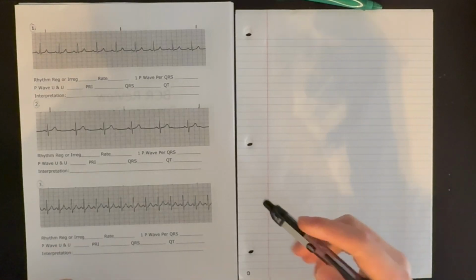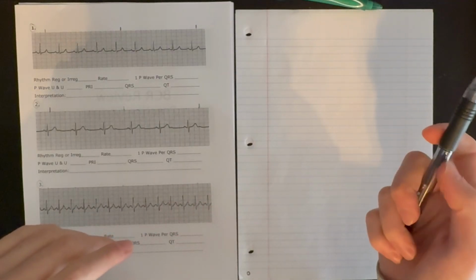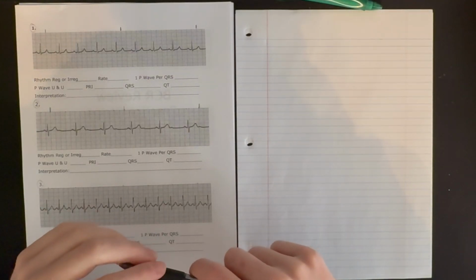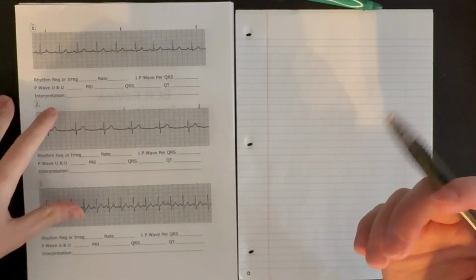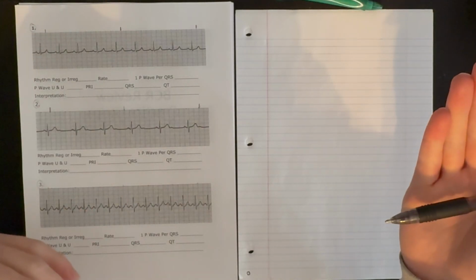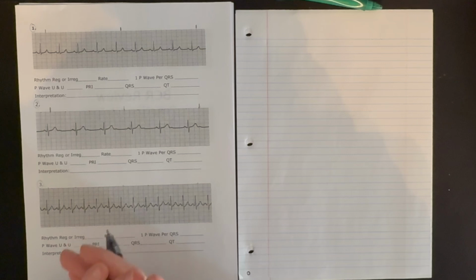Watching the previous video where we talked about the normal conductive pathway in the heart and how that produces the image we see on the ECG, particularly focusing on lead 2, which is the lead that is most often used, or the one that is chosen to be portrayed on our telemetry, because we can't look at all 12 leads at the same point. Or if you're talking about a 5-lead, same thing. Lead 2 is most often the one that's picked to look at continuously.